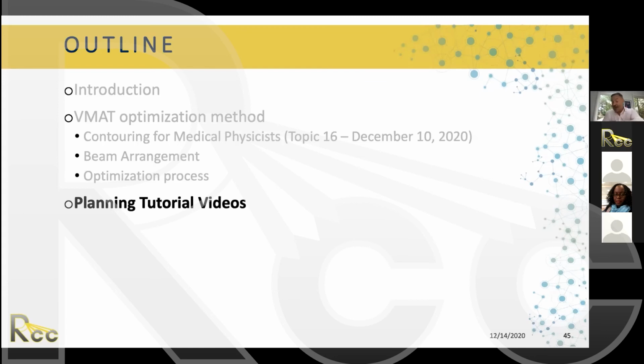But that's okay. This is something that in your institution, for example, if you're already doing IMRT plans and you find out that 150 works well, then it's fine. We used 200 and 100 just because it gives you a little more freedom when you're changing the priorities. But when you think about priorities, remember they're all codependent. Is that okay? Yes, thank you for that.